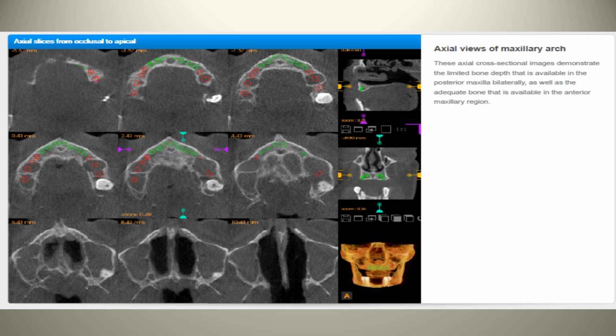And in the case of the mandible, similar sorts of things apply, and possibly issues with respect to nerve lateralizations, or basically not being able to place an implant as a result of some sort of nerve being involved in the surgical area. And you can also see that you get the traditional scans as well as the scan views. If you download these into your own software, you can go through these things in three dimensions and check out these areas yourself, which is kind of cool.